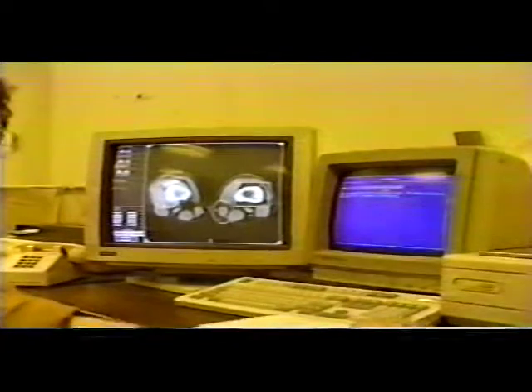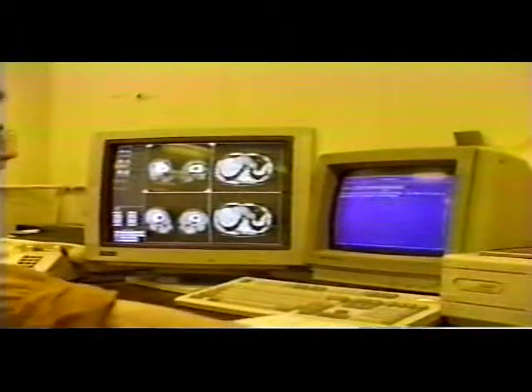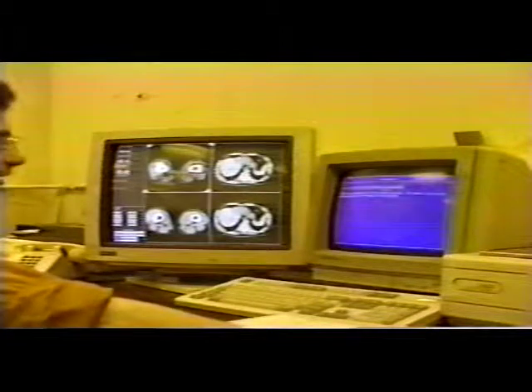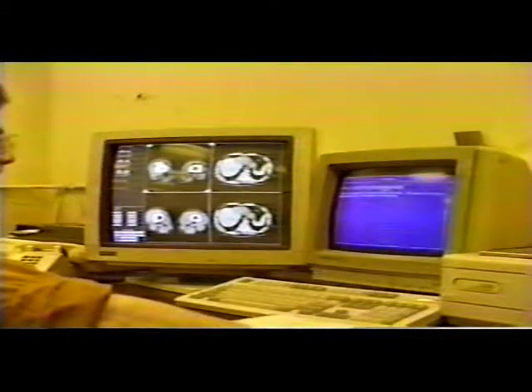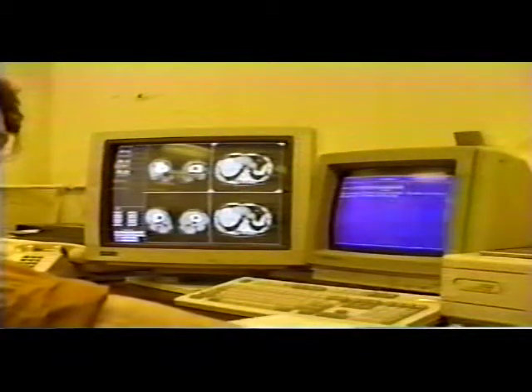The zoom button turns to an unzoom button, and I can click on that now and get the original image back. It even redrew the regions of interest. Now these will automatically be saved on the optical disc when I click onto another picture, and save time to update anything on the disc.